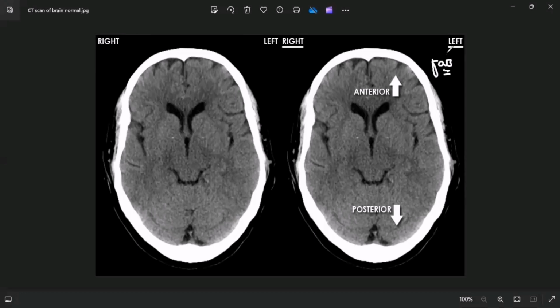And you know how fats behave. They are dark, or blacker. Do you get it? That is why all the dark areas here are white matter. Are you following? What structure have I outlined? The lateral ventricles. Excellent.